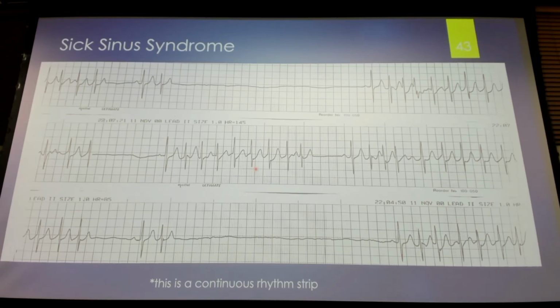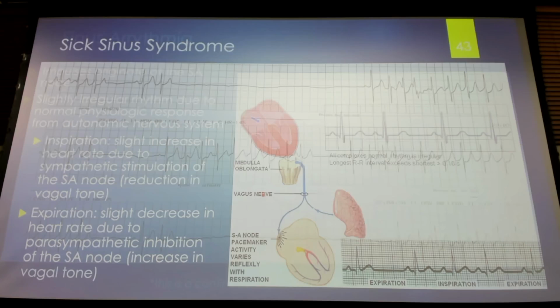They cannot go home. If you have anybody's ECG that looks like this, it is bad. That sinus node is really trying to die on you. And the problem is we have other parts of the heart that can take over pacemaker function, but not for the rest of their life. We need something that's going to pace them normally for the rest of their life. And so those patients will be admitted and they'll get a pacemaker.